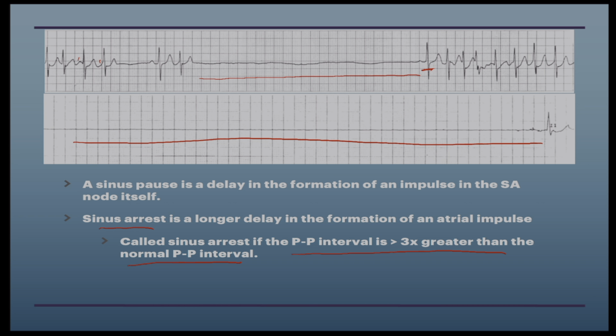There can be multiple different reasons for sinus arrest, blocks, and pauses. It could be benign, like a sinus block. It can happen, and that's okay. It could be a cause of sick sinus syndrome that we'll talk about in the next slide. The patient could have heart disease or some sort of inferior wall myocardial infarction that's leading to this, or it could even be myocarditis, which is inflammation of the heart.